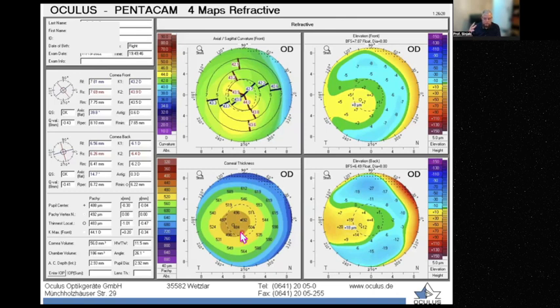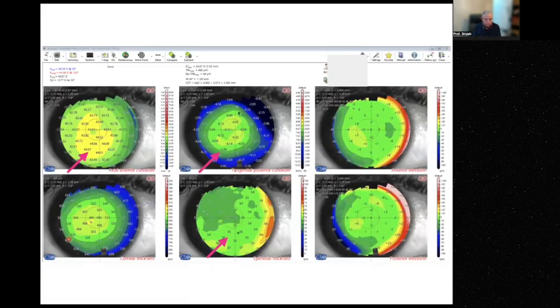For example, if you study using epithelial mapping and corneal biomechanics, it will give you a better idea about the patient. So this is the epithelial mapping. As you see here, this is the axial map. This is the posterior tangential map. I use the posterior tangential map whenever I feel suspicious, and this will show me if there is asymmetry. Here, the asymmetry is minimal on the posterior surface. So we can say on the posterior surface there is nothing. It is all about the anterior surface.